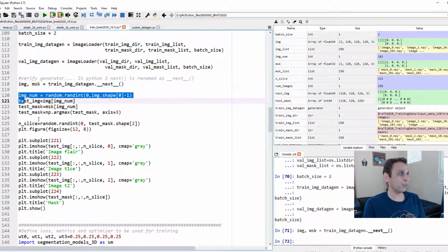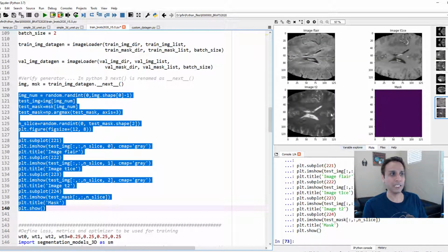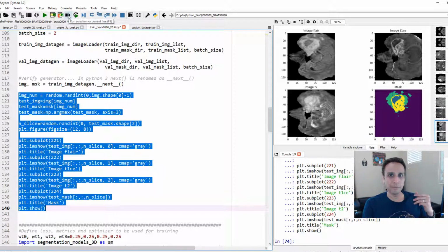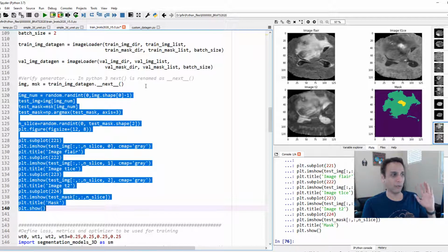Let's go ahead and plot this one more time. This time we are actually checking the generator itself. Again, why am I doing that? Because I'm crazy. I don't trust. I have trust issues here. That's why I'm doing this. I just want to make sure I am seeing what goes into the model.fit. Yeah, this is going in there and everything lines up pretty good. I don't like these little things. I don't think anyone annotated these, but anyway, let's go ahead and run this one more time. No annotations here. Annotation here matches very well.